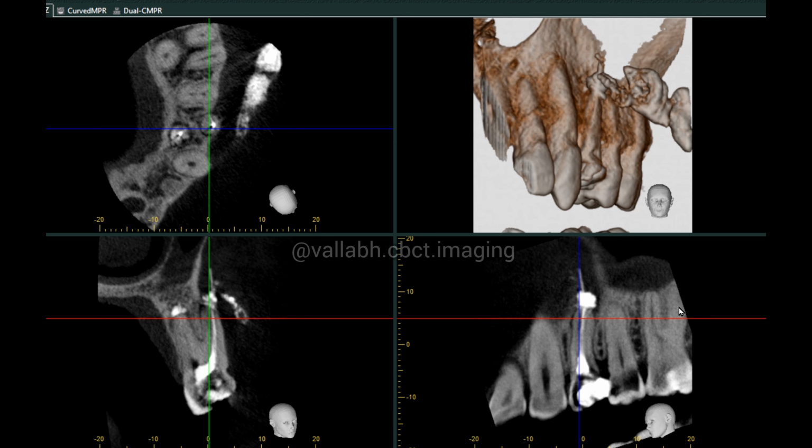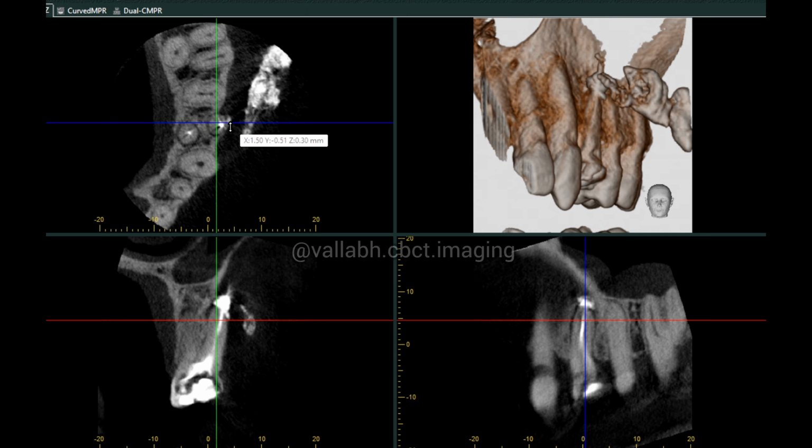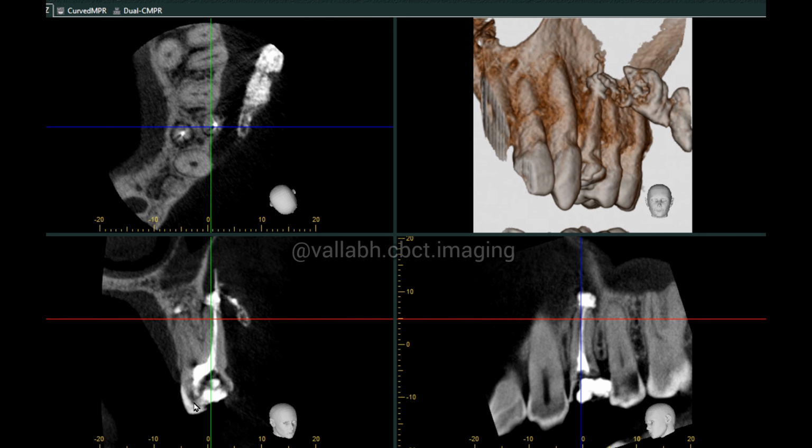Other causes could be apical over-instrumentation, where the enlargement is beyond the foramen, which allows the gutta percha to pass freely, or apical root end resorption because of inflammatory changes. Suppose a tooth is grossly decayed and there is periapical pathology, and the periapical pathology has caused resorption of the root apex. In such cases, once the root canal is started, the sealer is extruded. Sealer is added in the root canal system, and it may extrude out of the root canal system and invade the periapical tissues.